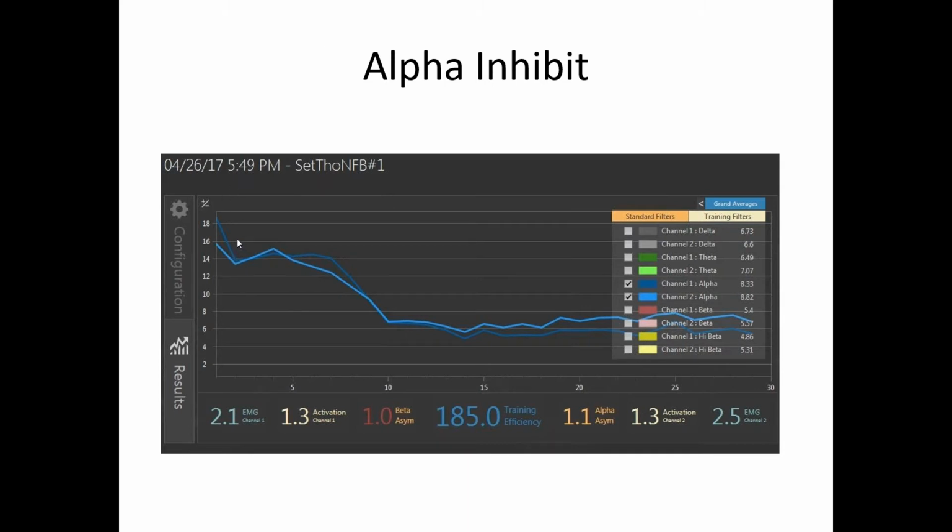And we have three things that we're looking for here. We're looking for convergence, compression, and layering, because we know as those move in a normative direction, we're going to see Z equals 0, the brain moving towards a normative map. Just want it to move in that direction. Any little bit of movement in that direction could be the movement that you're looking for. You know, the movement's on your shoulder, Jude. It just has to be the right movement. So we want to move that brain, and we have to work with it, not force it.